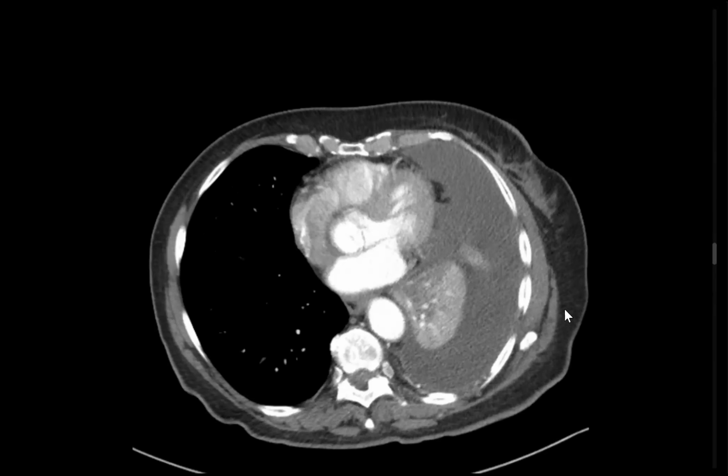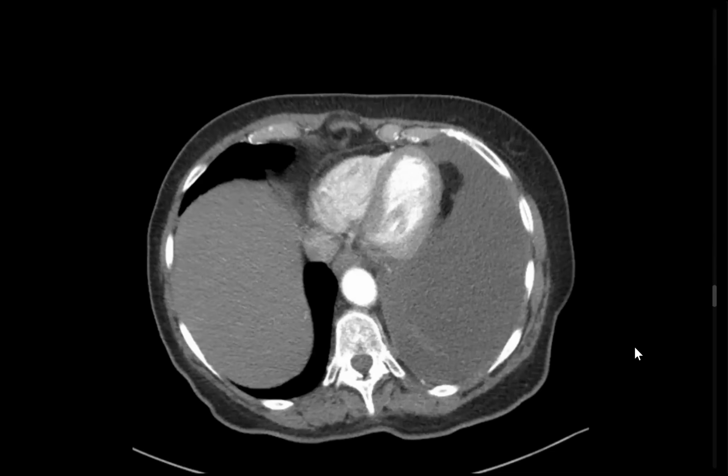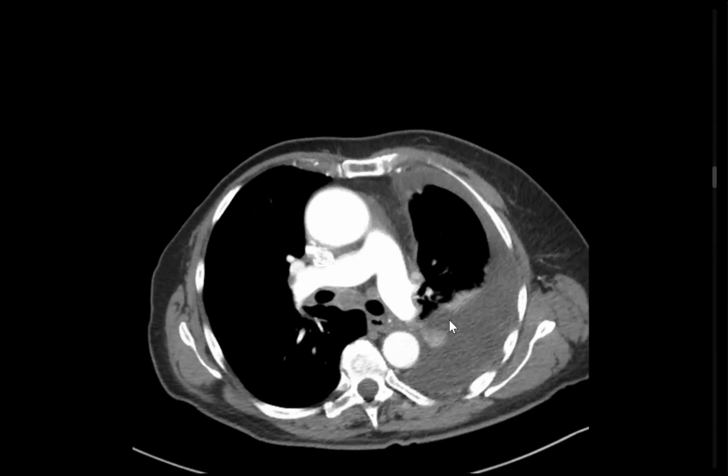Very good. And as you mentioned, we have pleural effusion. You comment also on the upper part of the effusion because sometimes we may see some nodularity here. Okay, but till now, you summarize and finalize. I want to see the lung window to see for the nodules. Good. We saw multiple nodules in the lung window.